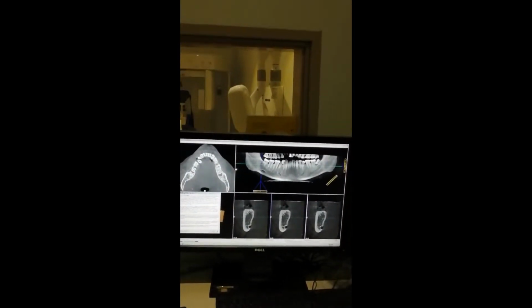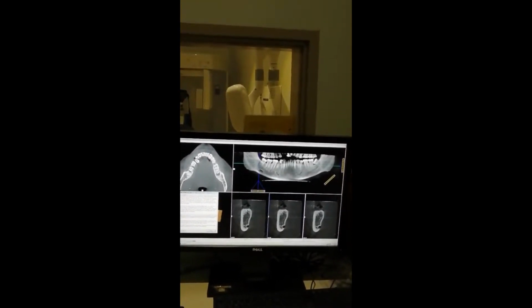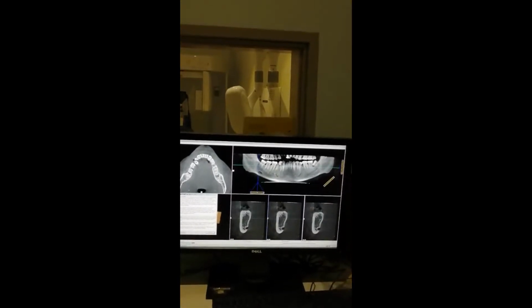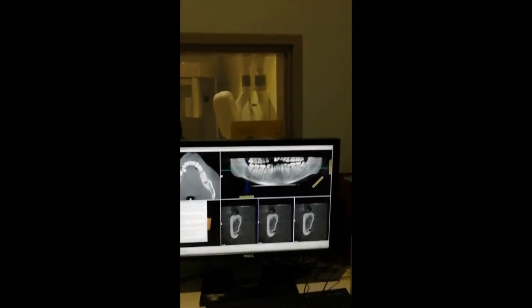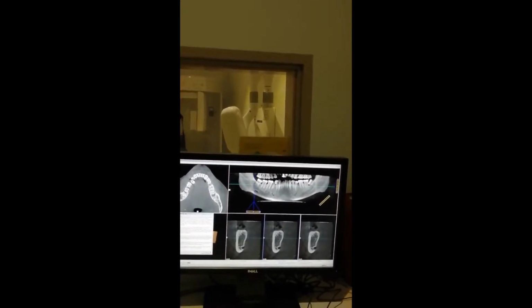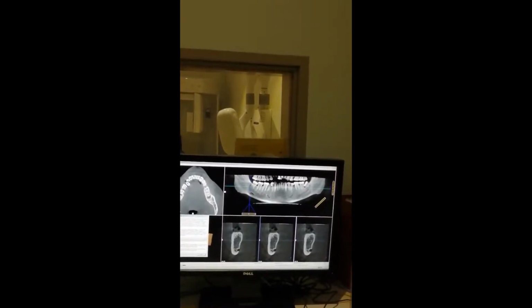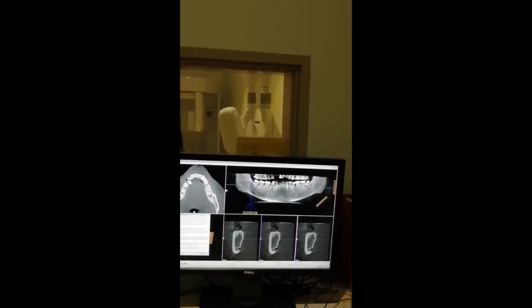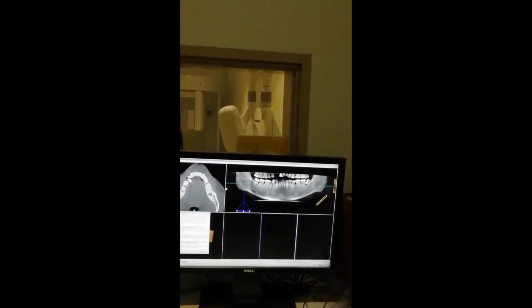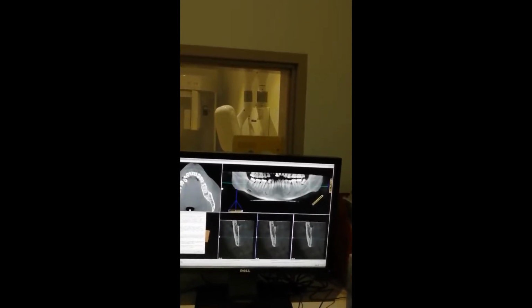Just click on that. Then how do we estimate the nerve canal? See, we want the nerve entry and nerve exit. All of you know that the mandibular nerve enters in the ramus of the mandible. Correct? It starts from here, gets inserted. It comes through the alveolus inside, supplying all the teeth, and then exits from the mental foramen. So this is the entry point, right? See, this area is the entry point.